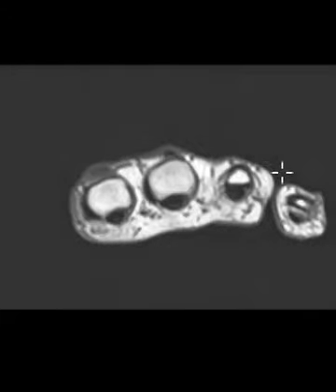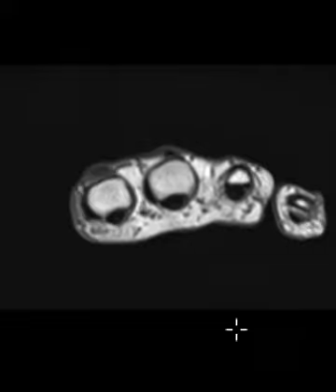Hello, this is Dr. Gay from First Light MRI, and this is a 60-year-old male with complaints of locking, pain, and stiffness in the third and fourth fingers. When he flexes his fingers, they become tight and trapped, and this is a case of trigger finger.